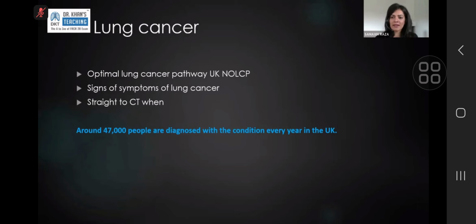You think it's 11 millimeters. It's a bit spiculated. The location is too medial, for example. It's right next to the pericardium, so if that grew significantly, it can eat into the paramediastinal structures. It can change the staging. So I don't want to take the risk. You can upstage the management at any point. But for any small lung nodule, 5, 6, 7 millimeters, stick to the original surveillance program. Give the patient a chance because you know they are coming back.